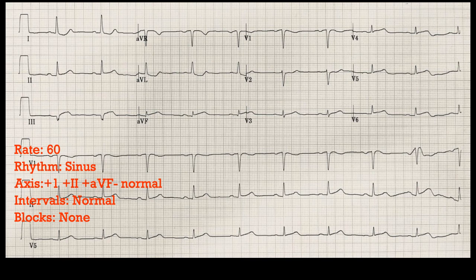How about ischemia and infarcts? We see ST elevation in the inferior leads and maybe a little bit in the lateral lead like V6, which can correspond as the right coronary wraps around the backside of the heart. But we also see ST depression in lead 1 and AVL, so that's concerning for reciprocal changes. In this setting, this looks like an inferior, maybe inferolateral STEMI, but certainly some lateral ST depression, which would strengthen that case as a reciprocal change.